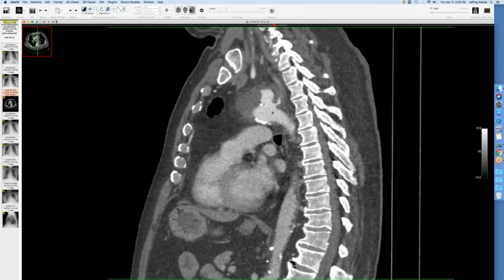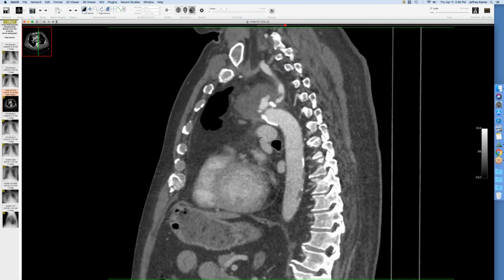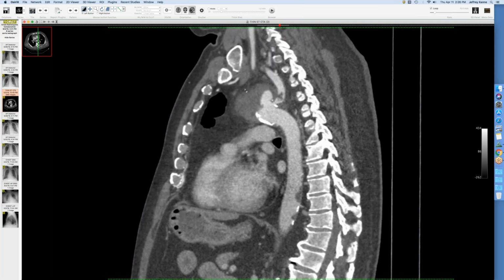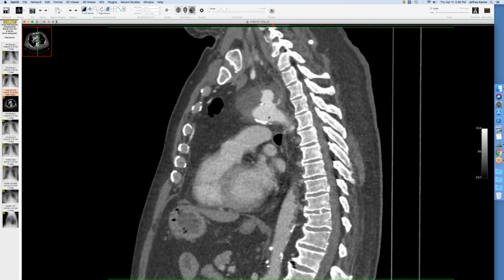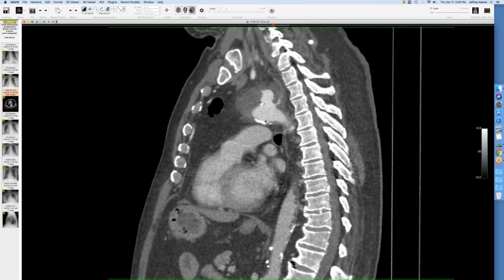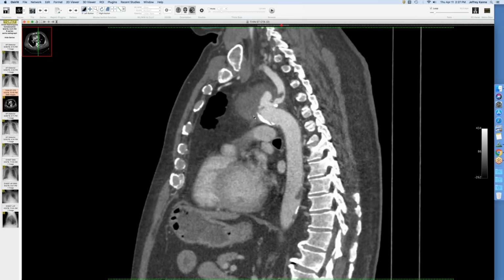But in somebody with an infection, you always have to think about a mycotic pseudoaneurysm. I think it was starting to move a few days before he was transferred here, but clearly something changed and it ruptured, whether his blood pressure got back to normal, or he was hypertensive, or it just happened when he was still in the hospital. So anyway, they put a stent graft across this, and it looks fine now. It's excluded, and the hematoma is slowly resolving.